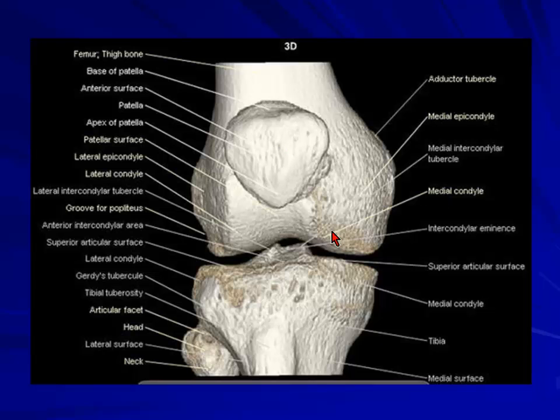So you're looking at the fibular head. So that's the lateral part. This is the medial, which is slightly protuberant. So you've got the medial epicondyle, and that's the condyle. So condyle and epicondyle, and then it comes into the articular surface, and then you go into the lateral condyle and lateral epicondyle. That's the adductor tubercle and forms the adductor canal, and the adductor muscles pass through and attach.